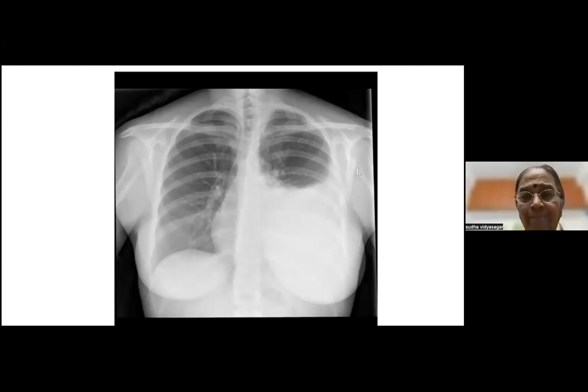What is that? What is that? Effusion, hydropneumo. Okay, go on. Effusion. Okay, right hydropneumothorax, left hydrothorax. Okay, left pleural effusion with meniscus sign.